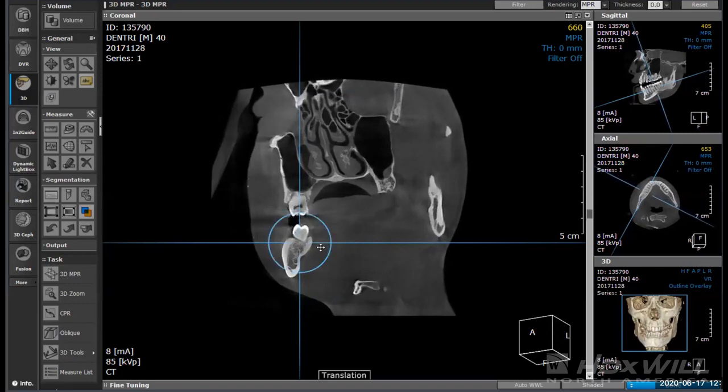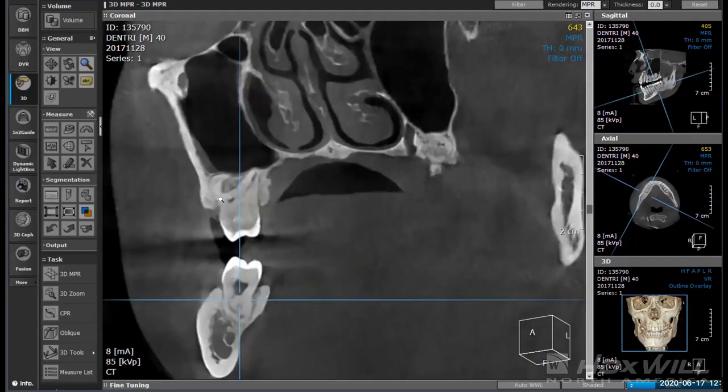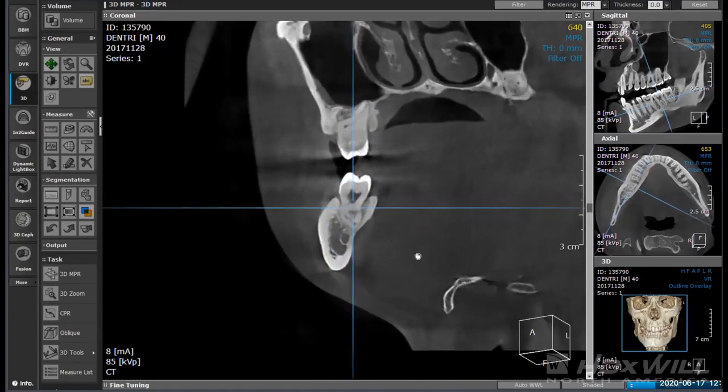Again, in this case, you can see this patient has a pretty significant undercut. And we can move along and we can see there's our tooth there. We can look at the bone structure. I can go ahead and blow this up a little bit and I'll center it so that we can examine the tooth as it sits. And again, we can see the tooth in the bone itself. We can see the nerve canal and we can start to see some of the bone structure.